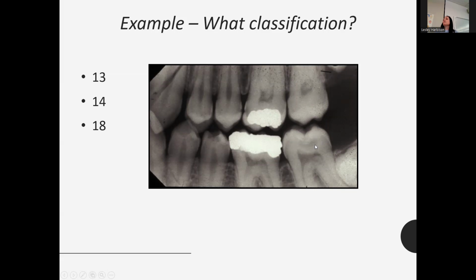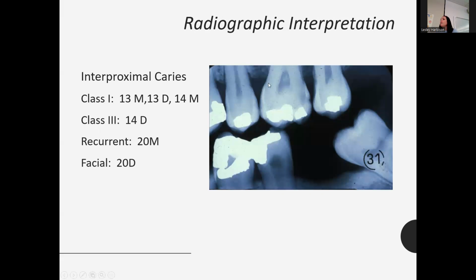Yeah, occlusal and severe. So I think what I'm gonna do just for future reference is anytime it talks about classification or the depth of the decay, I'm just gonna use both the terminology and the class. So incipient is stage 1, moderate stage 2, advanced stage 3, and severe stage 4. Like advanced and severe. So 3 and 4. 3 and 4 is more definitive. Yeah, true. Okay. So here we have some more.